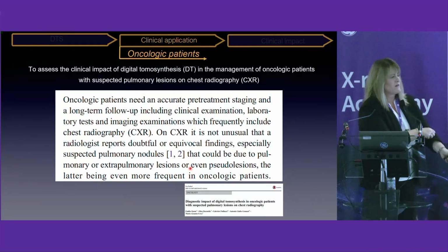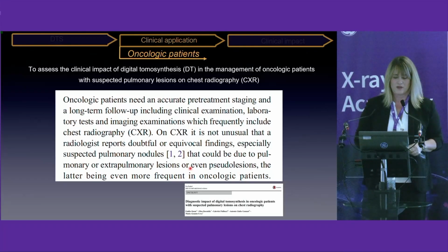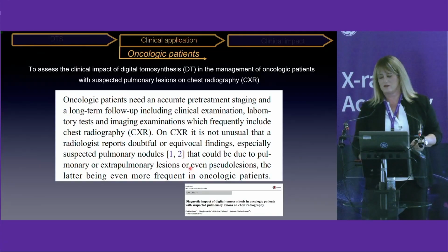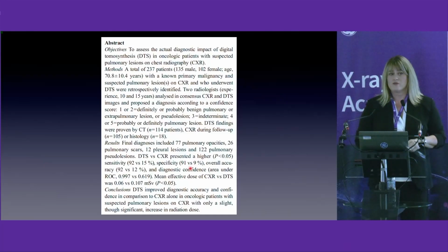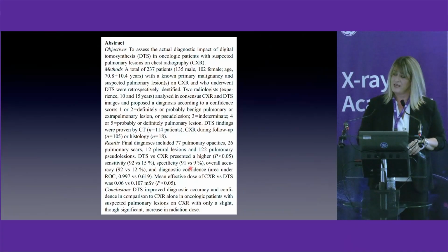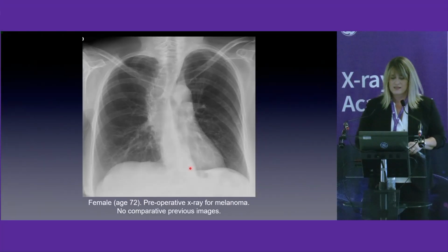So one of our research projects aimed to assess the clinical impact of chest DTS in the management of the oncological patient with suspected pulmonary lesion on chest X-ray, both as a first examination or during the follow-up. And what we found is that we reduced by half the need to perform CT scans after the implementation of DTS in the workflow of these patients. So let me show you some examples.